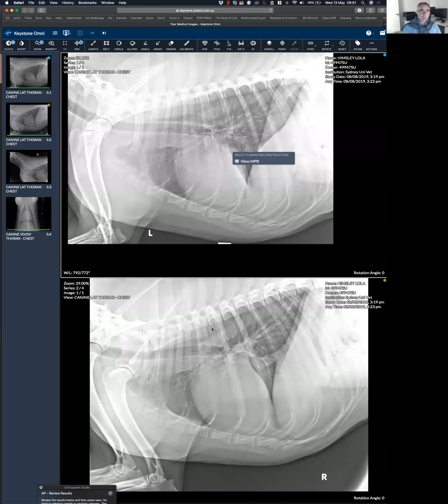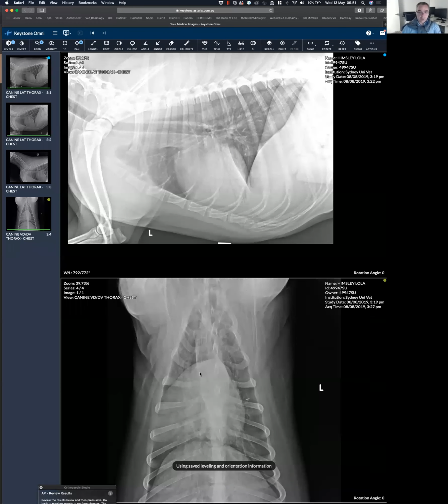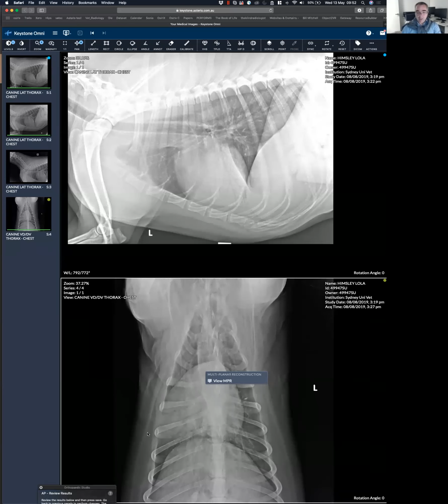And the price that we are paying is that in a lateral projection, it's not that bad, but you can assume that we are only looking at the upper lung. Make sense? So if you take a left lateral projection, you're looking at the right lung. If you take a right lateral projection, you're looking at the left lung. And that explains why, in this case, which is technically beautiful, we don't see in the right lateral projection the changes that are occurring in the left lung. Sorry, right lung. Is that okay? It may be counterintuitive, it may be hard to believe. This is a beautiful case to show that.